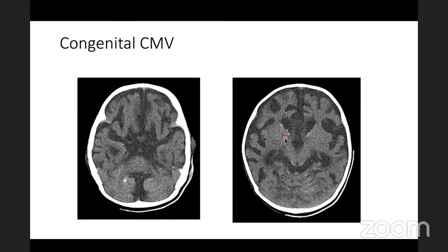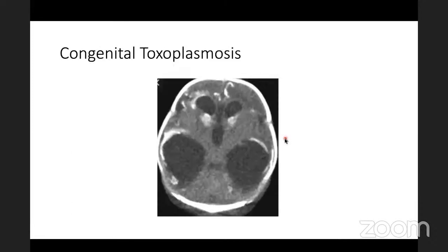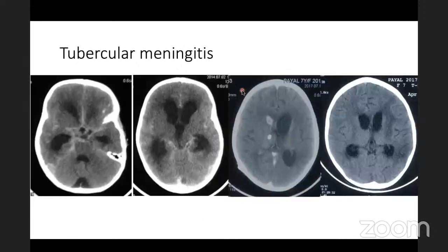So another infection which we think of when you consider calcifications in the brain is that of a child with a large head, and the diagnosis in that case would be congenital toxoplasmosis. These children have a predilection for developing hydrocephalus in the newborn period, and they can have very dirty, diffuse calcification. CMV produces a very punctate, regular picture of calcifications, whereas toxoplasmosis is described to produce a very thick and diffuse picture, dirty calcification. Along with a large head and hydrocephalus, you think of toxoplasmosis more than CMV, and both can have eye findings. You know that chorioretinitis is an eye manifestation, right?